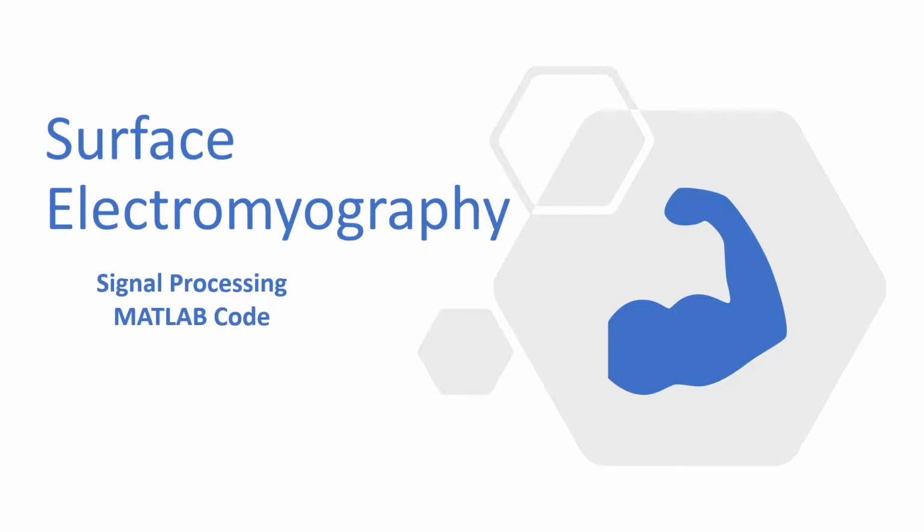Hi everyone. In this video, we're going to run through some MATLAB code that I wrote for signal processing of surface electromyography or SEMG signals.